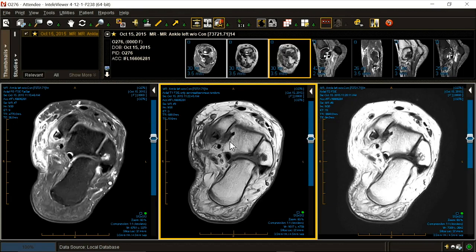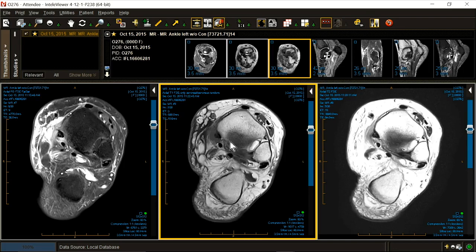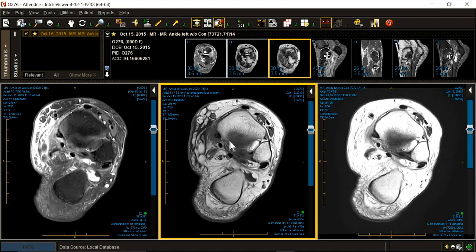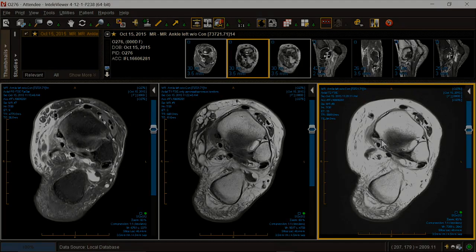So where is the posterior tibial tendon at risk? Usually it starts right at the bottom of the medial malleolus, unless you've got an anomaly or deformity, like a little spur or bifid groove. So there's a spur in the front, spur in the back, that deepens the space and increases the friction coefficient of the tendon as it glides. The tear starts there and then propagates distally.